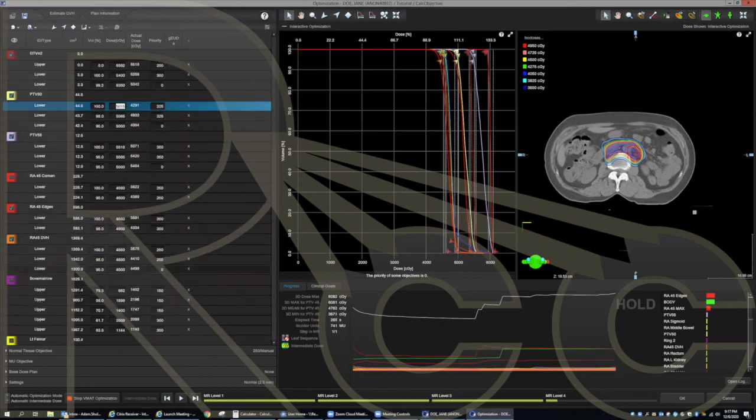Okay, I think I'm splitting hairs at this point. I could fine tune it more, but I think everyone gets the point without wasting any more time. This one's D95 is right on. This one's right on. This one's slightly low. I could fine tune it more. I'm not, for time's sake. I think everyone gets the idea, right? So I'm gonna go ahead and finish this off.